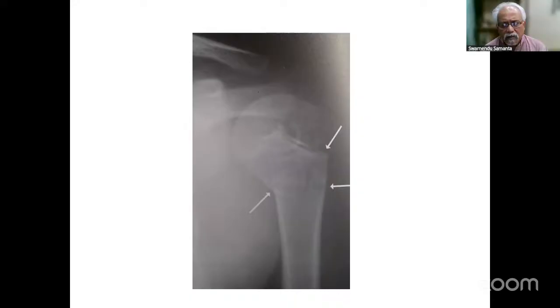I think this is not a big problem if you regularly see the AP X-ray and the lateral film of the humerus, because you see how the scapula and the joint overlap. The classic AP view of the shoulder is not shot exactly from the front. It is 30-degree oblique, so that you have a clear space between the glenoid and the humeral head.